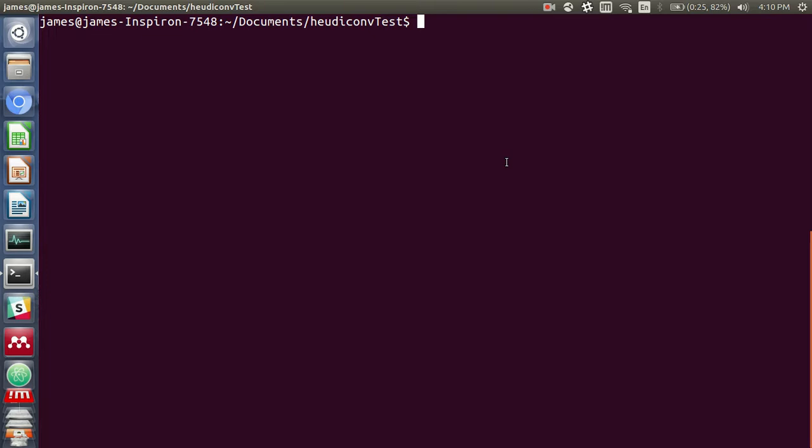So I'm going to get started here with the first command that we need to run, which will be docker pull. Let me write this out. docker pull nipy/heudiconv. If it's not already the most up-to-date version, it'll download. I guess specifically we should pull the latest one.